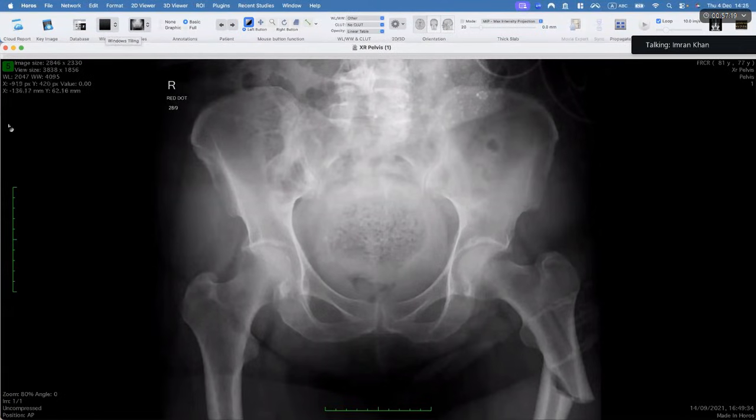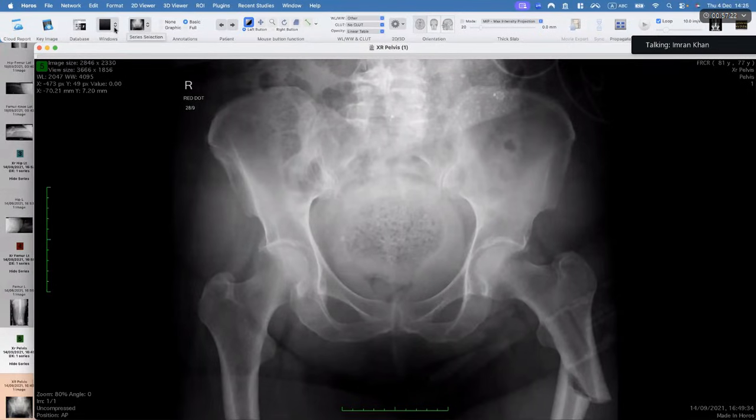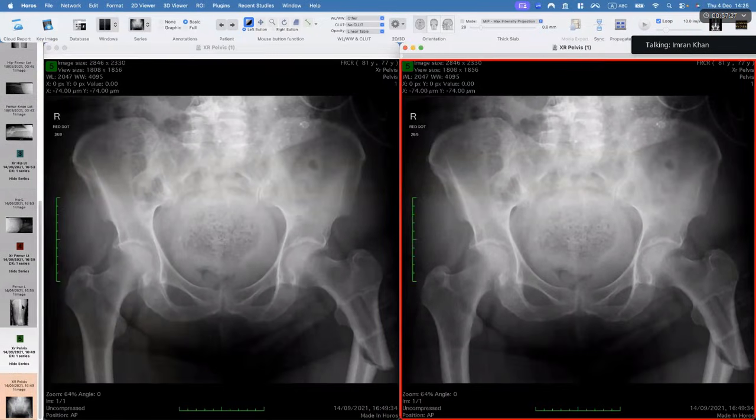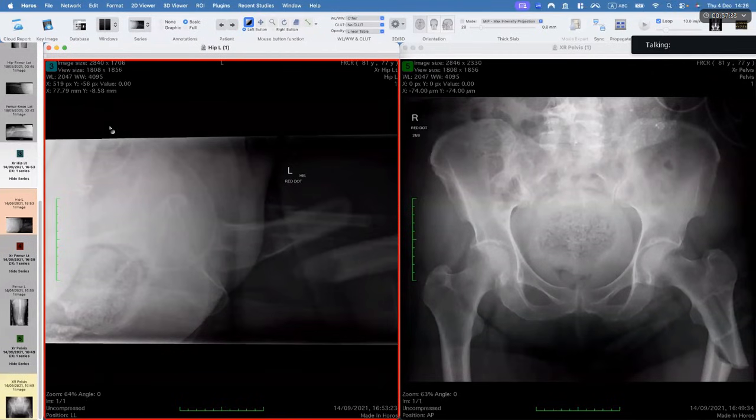Okay. All right. Hold on. Let me bring up all the images. Okay, so there's one here, and there is one there. Tell me what you think.